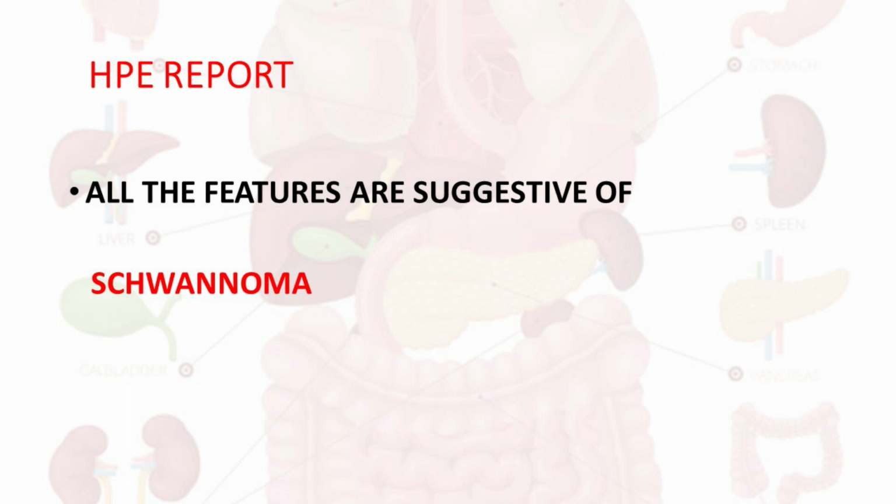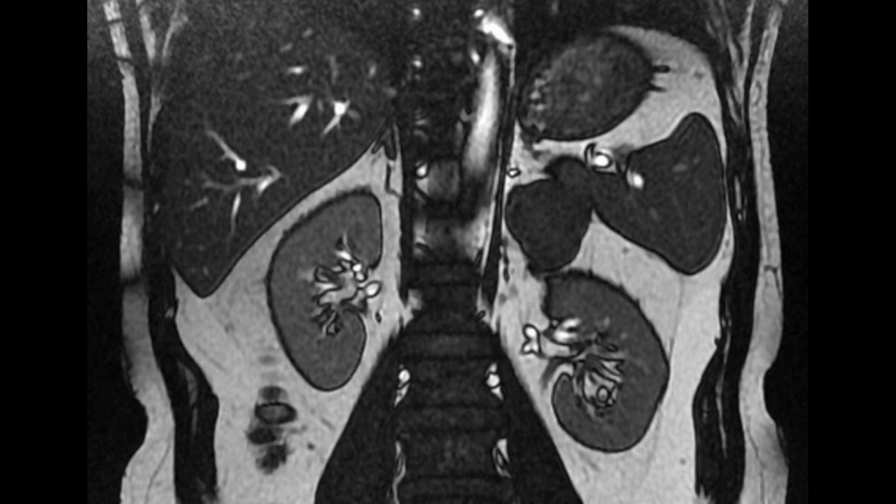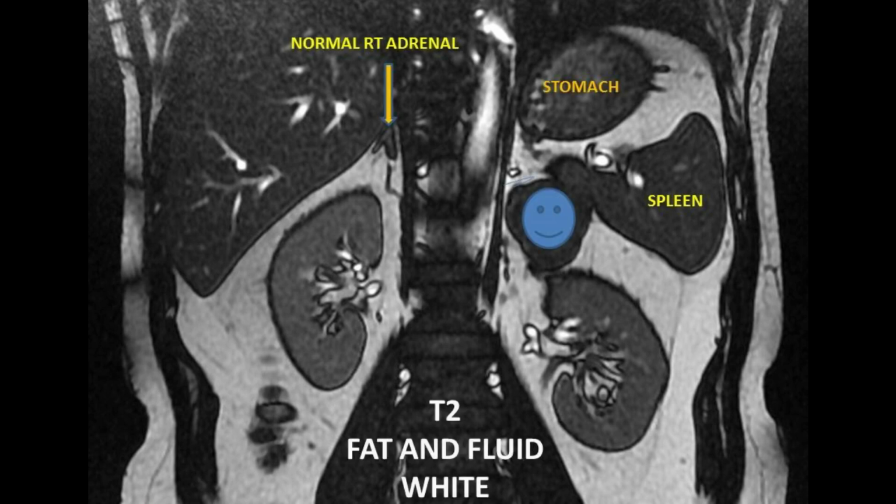In general, especially for adrenal schwannoma, MRI will show low to intermediate signal intensity on T1 weighted images and also high signal intensity in the T2 weighted images, with heterogeneous enhancement after IV contrast. But in this case, due to the fibrosis, the MRI intensity changes made it difficult.